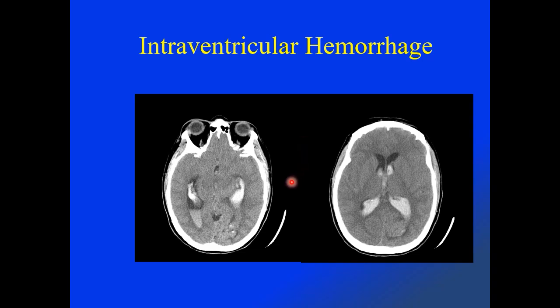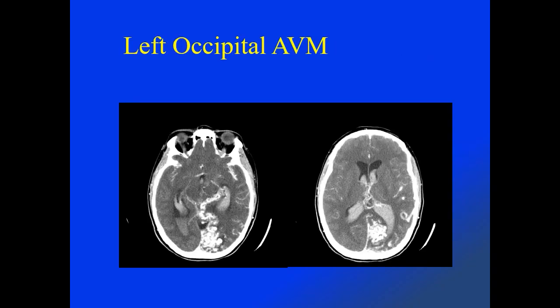In this patient, the patient presents with hydrocephalus with intraventricular hemorrhages, as well as subtle areas of abnormal density in the region of the left paramedian occipital lobe. Post-contrast images nicely demonstrate a large left occipital lobe arteriovenous malformation with abnormal blood vessels along the mesial aspect of the left temporal lobe and multiple abnormal draining veins along the cortex.